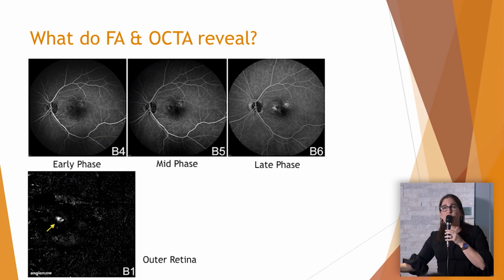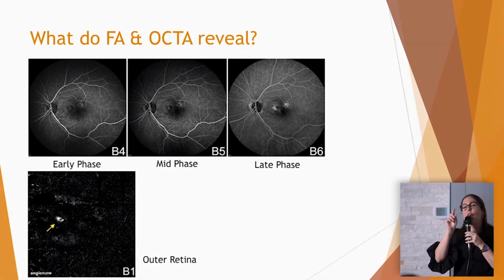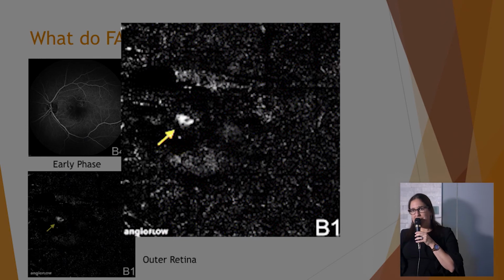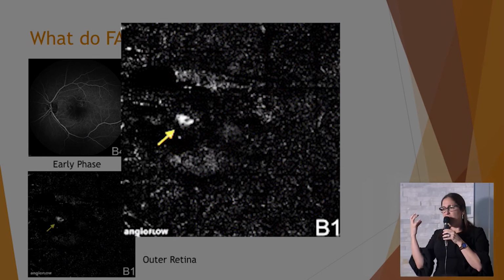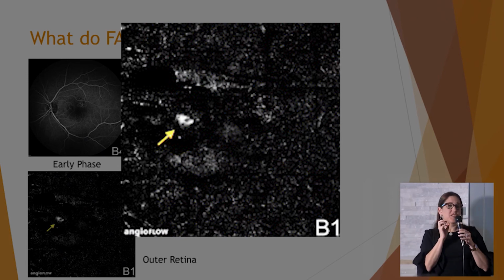You can see on the fluoresceins that something's beginning to stain, okay, especially towards the late phase. If you look at our angio, the outer retina, again, is the critical part because that's where the vessels originate. That is the point or the source of insult. And these vessels with RAP tend to highlight like a Christmas tree. They're very small and they're very, very bright.